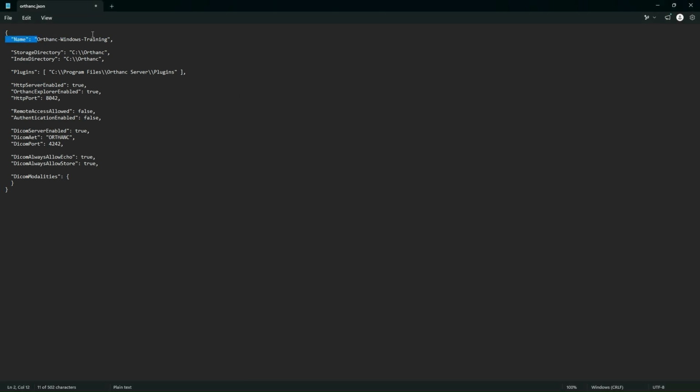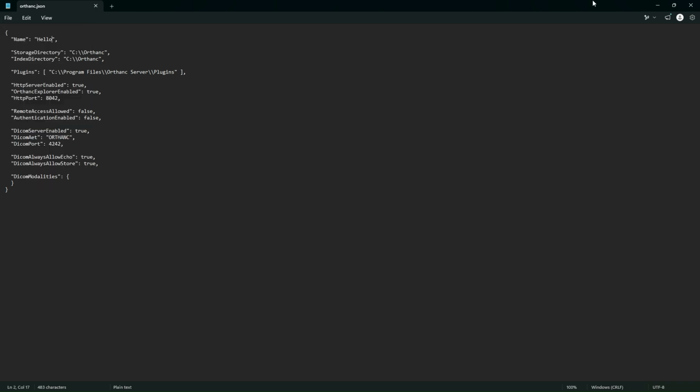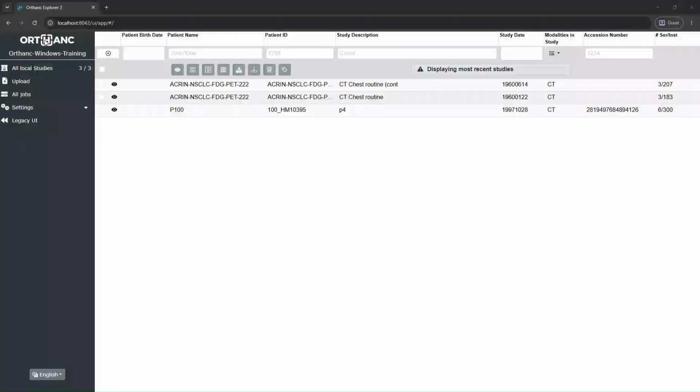So, for example, if I wanted to change this, and we remember that the name obviously is going to be text, so we're going to have to put it in quotes. Let's just call it hello. Right, so I'm going to call it hello. I'm going to go in here and I'm going to save it. Now, if I go and look at my Orthanc right now, it is still obviously showing the old configuration because we haven't done anything yet.